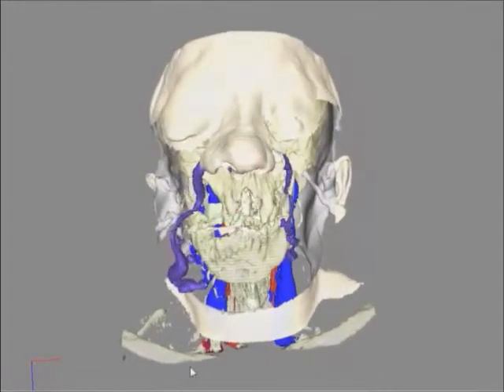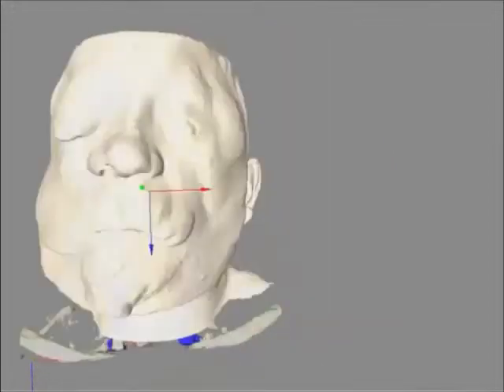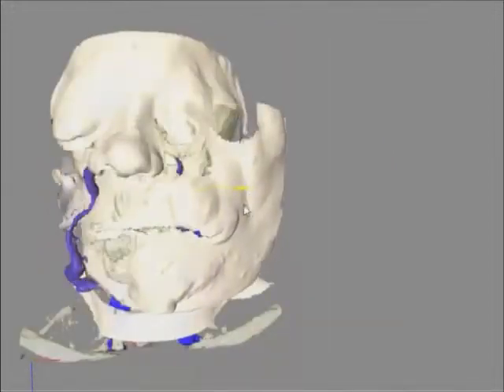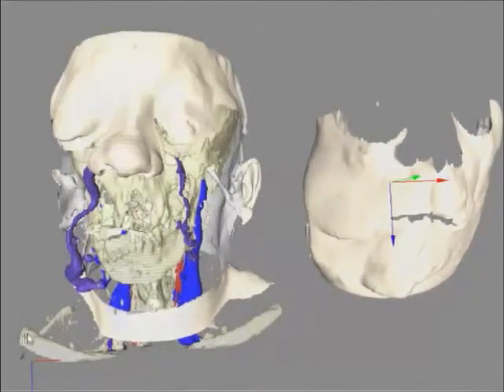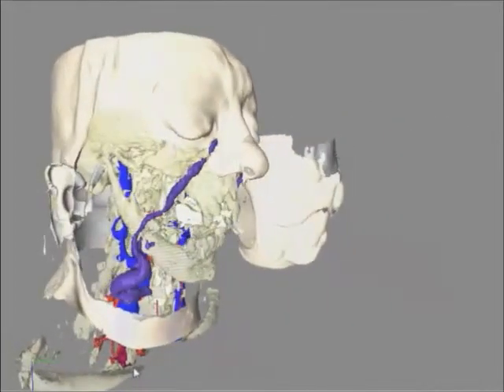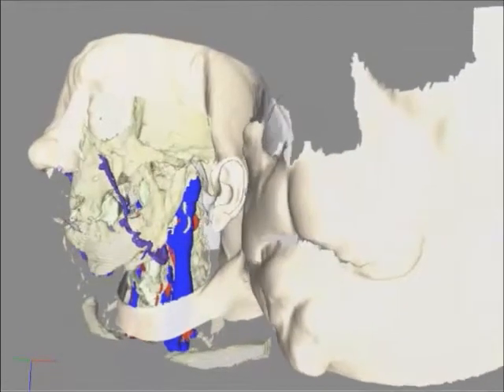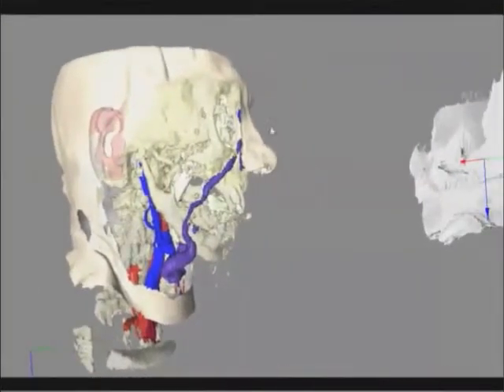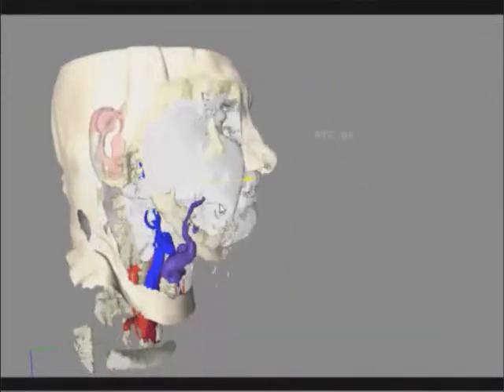With this program, we can use tools that are similar to cut and paste for mirror images, nodes, etc. to simulate the removal surgery of this plexiform neuroma that actually took place later on. The program allowed us to observe the great vascular diversity of the plexiform neuroma, which we would confirm during the surgery, as shown by the dilatation of facial veins, and therefore foresee the presence of heavy bleeding during the operation.